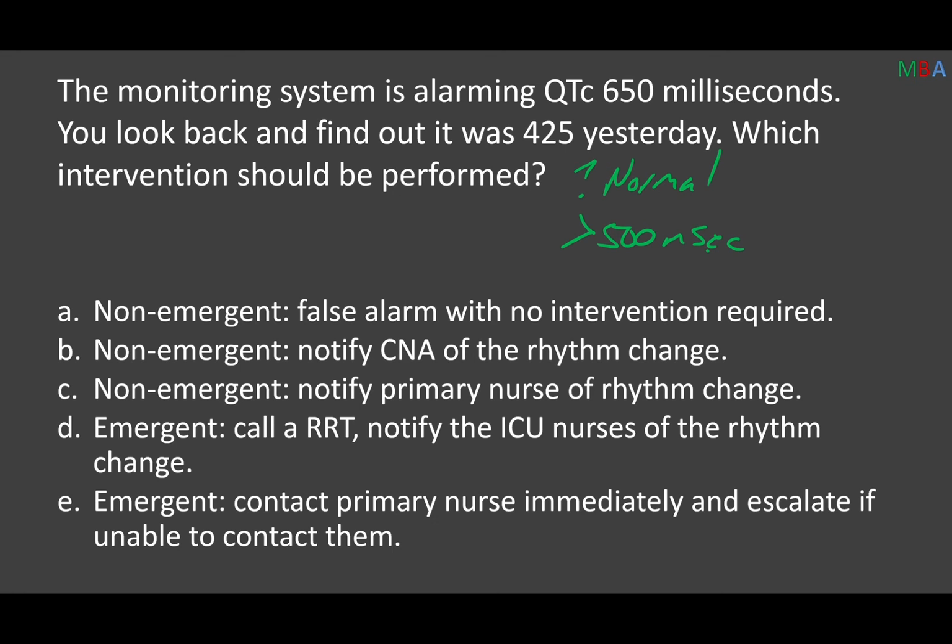and ask again, is this an emergently high item, or is it just something that we need to keep a close eye on? And the truth of the matter is, as long as they're still in a normal sinus rhythm or something like that, it's not emergent. So for this, it's not a false alarm. And I'm not going to say that these are emergent. And so telling the CNA really won't change anything, because it doesn't have to do with lead placement or anything of that nature. It really just leaves us with non-emergent, but notifying the primary nurse of the rhythm change so that they can go through and figure out what the cause of that is, or work with the provider.